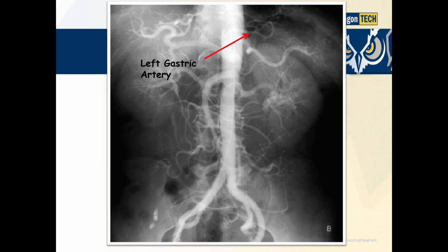We'll move on down. Here you can see the left gastric, quite a bit better than what we could before. Left gastric. Splenic artery coming across here. Superior mesenteric artery. See, it's quite large, feeding the gut.